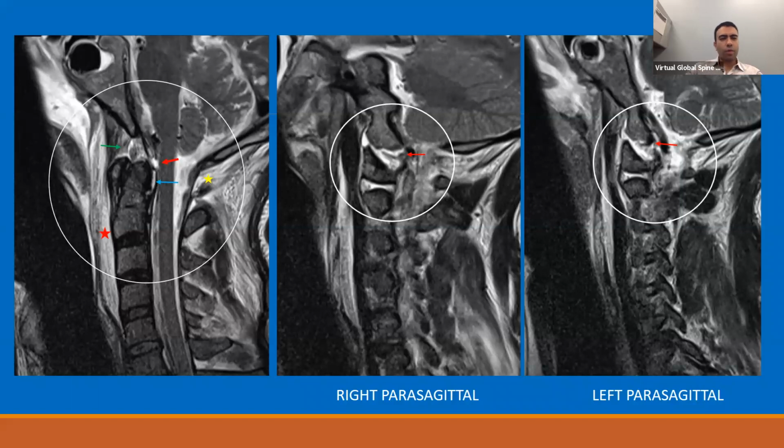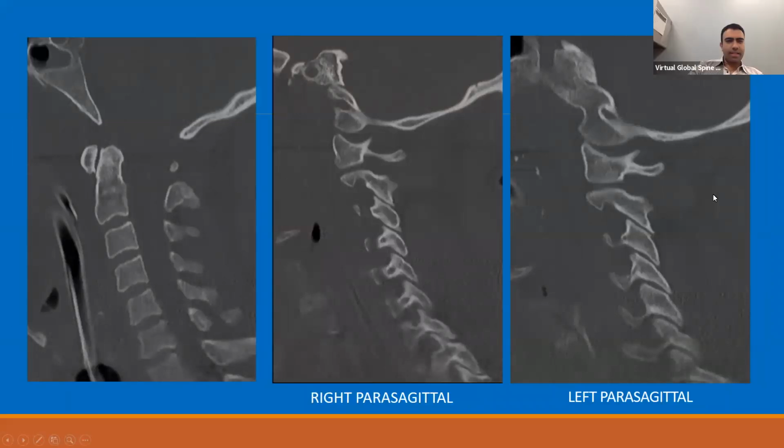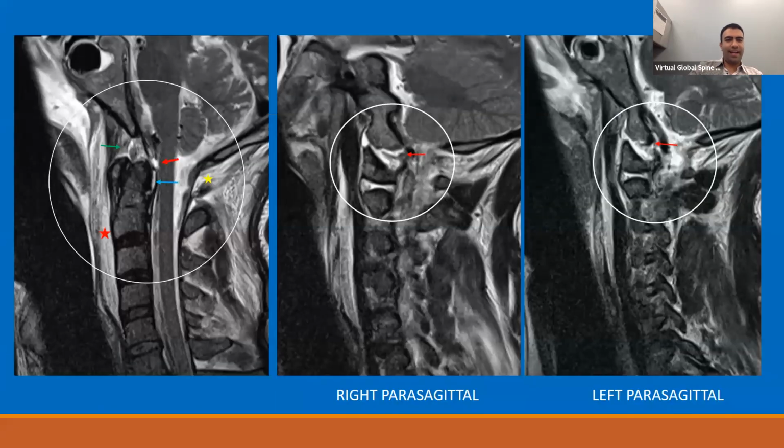Yeah, how old is this patient, if you don't mind me asking? It's a young adult. Yeah, so this is the type of patient that unfortunately tends to come in on Friday night at midnight or Saturday. This is one of those cases that we always dread, other than something like a rigid spine fracture over the weekend. These are tough.